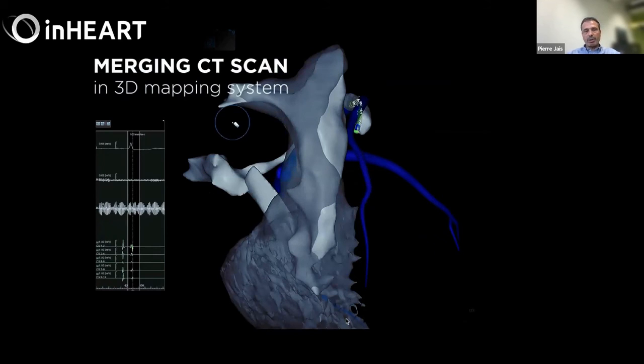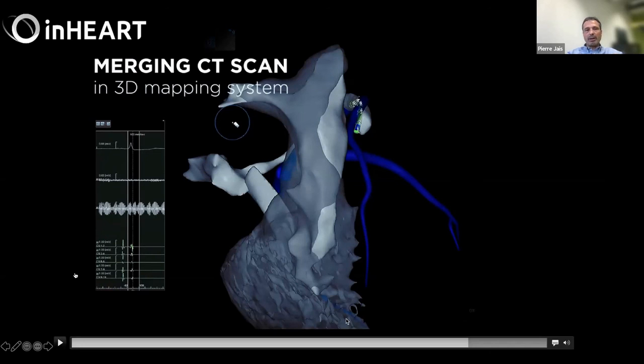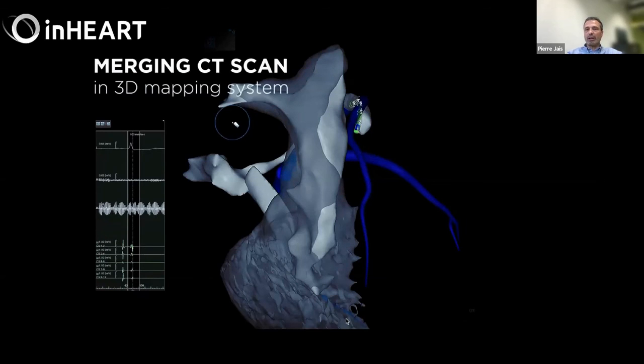I told you not to use the atria, and this is because we did that in the past and it didn't work. Simply you get obvious registration issues doing that. Again, that's because they are acquired during the image in systole and in diastole with your ablation catheter if you try to map them quickly. So it simply doesn't work. That's really important to understand.